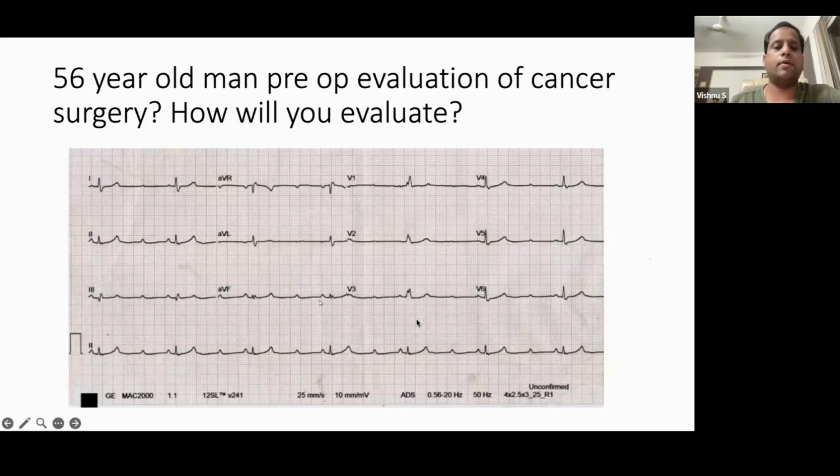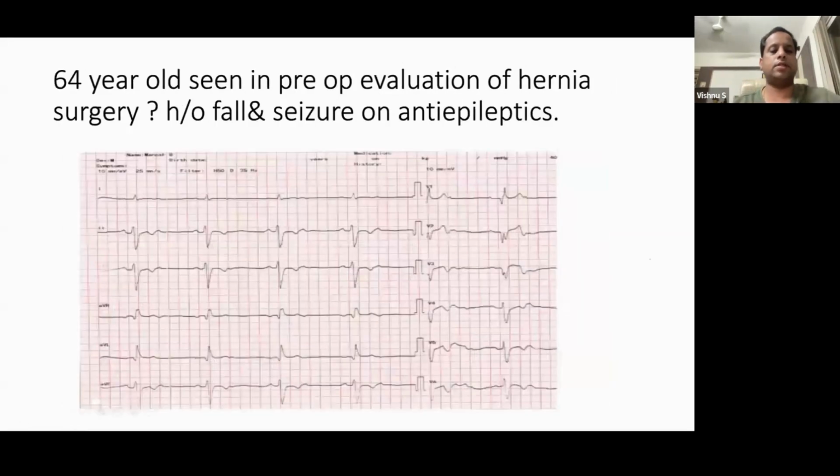So the next case, what's the diagnosis in this case?